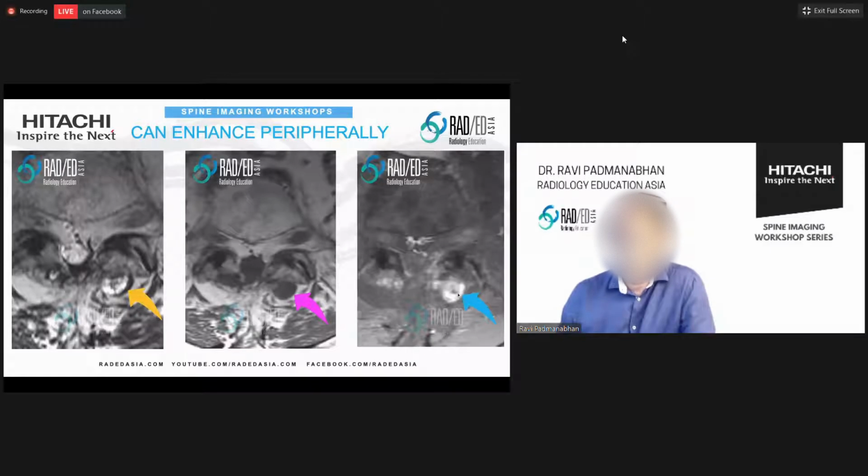But I think the thing is that with something like this, you really don't need to give contrast. But if you happen to give contrast and you see enhancement, it shouldn't put you off calling it a cyst. So given the location of it, the appearance of it, the fact that it enhances, it's still a cyst.